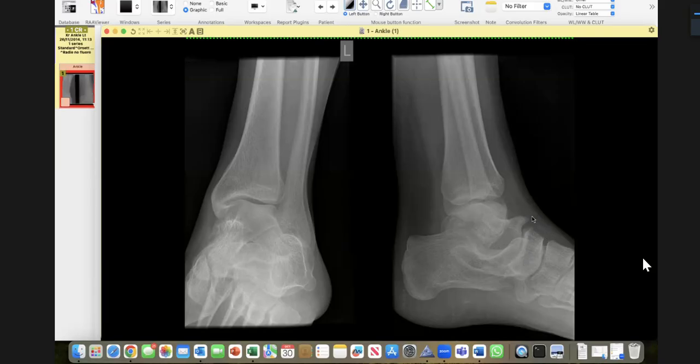The key finding here is this: you have to describe the talar beaking, and then this tells you that something is wrong. And another viva question which I did was, what will you do next? It is a classical viva question. Other foot, that is the answer.